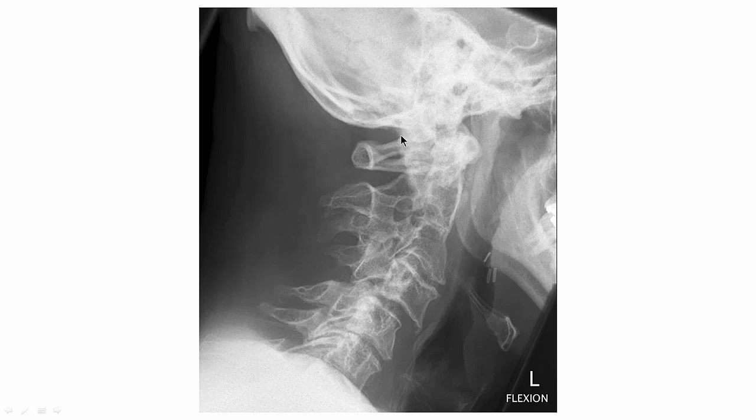So now let's look at this. Now, why is everything so weird looking here? How come we can see? What are those again? That might be a nice one to test you on, though, right? Because we can see. Well, the angle is not good. Whoever took the film, I don't see a collar, though. They just kind of messed up the film. The technologist could see the spinal laminar line fine, but this is the posterior arch right here. And that's because their head was tilted. Now look at the body of the ramus, the inferior part here. So you can clearly see these should be superimposed, so this is not a good image. Had some surgery here as well.